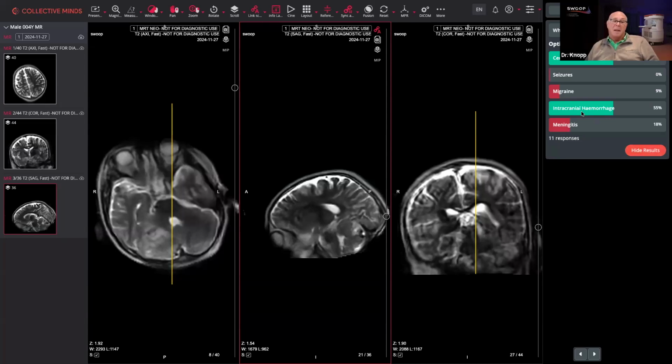And what we see, intracranial hemorrhage and cerebral arteriovenous malformation. And from looking at what limited information we have, we could have hemorrhage and AVM together, concomitant. I'm not quite sure what this is from signal dropout. This clearly could all be blood product, and clearly within my mind, within the spectrum of what's going on. Hemant, anything to add?